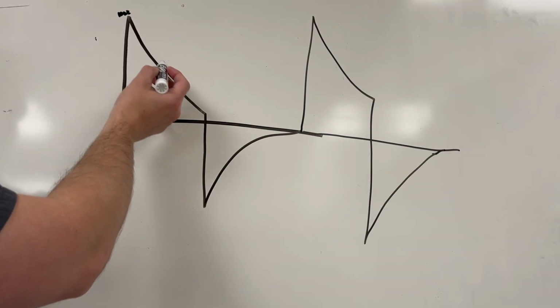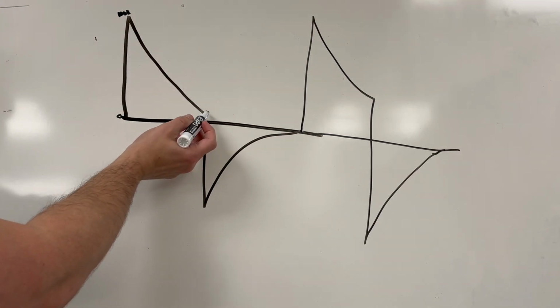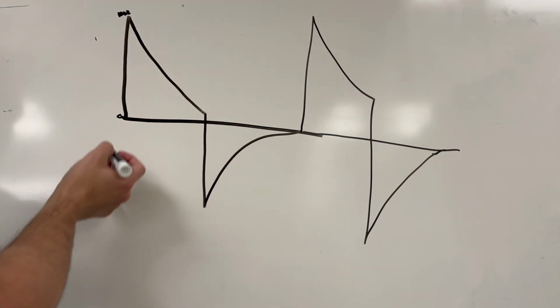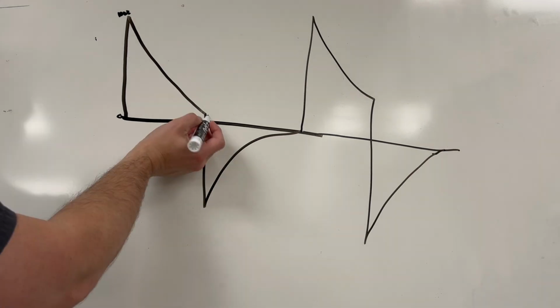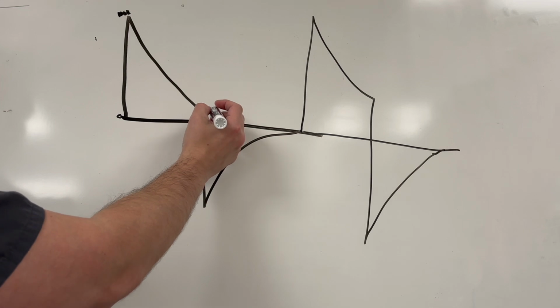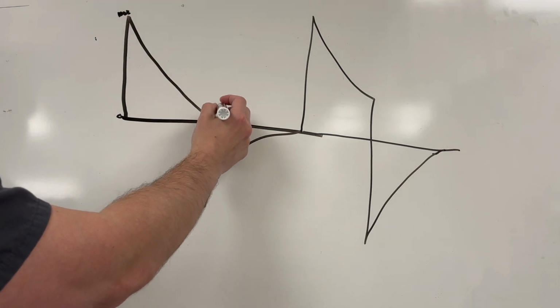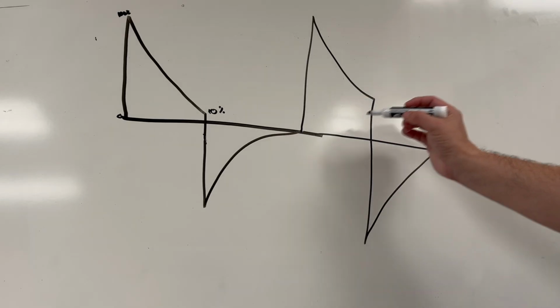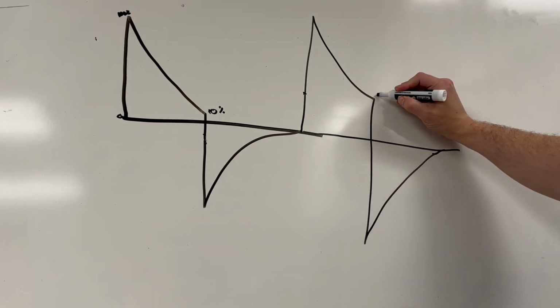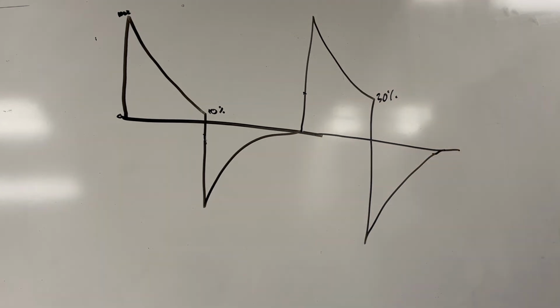As we decelerate, when the amount of flow movement in the lungs gets to a certain percentage compared to that peak, we're going to go into exhalation. So for here, if you were to drag this over, that would be like 10%. So this would be if we had it set at 10%. On this one, if we were to draw this over, it looks more like it's set at about 30%. And with your inspiratory cycle off, the higher the number, the shorter the inspiratory phase is, and vice versa.